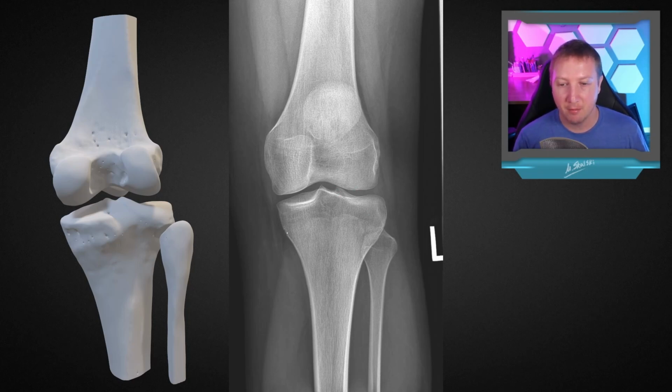All right. And so then we've got our metaphyseal region of the tibia here. And the fibula, the proximal portion here is the fibular head. And sometimes, depending on people's shape of their fibula, you might see it look like this, which is kind of more like the tibia, but sometimes you'll actually see a separate cortical line come in here separate from over on the edges here. And that's because if you look down at the cross section of the fibula, oftentimes it's going to be kind of more T-shaped.